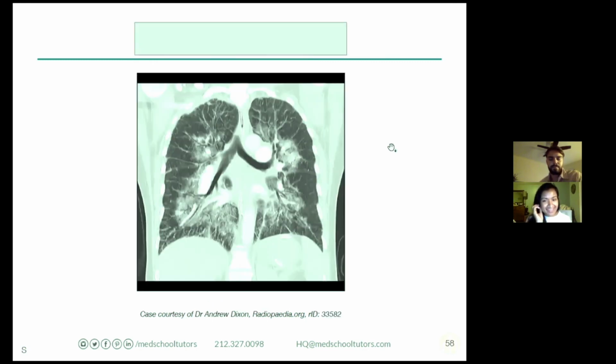Okay. And as a companion case to one of our cases from before, we're now looking at a coronal image. Again, I'm looking at lung windows, and this is a slightly challenging image, but looking at the lung fields, because they're giving us the lung windows for a reason, I see almost the distribution of the branching bronchus. This is the right main stem bronchus, and you see a branch coming up here, here, here. We see this ground glass opacification surrounding the bronchus, and similar here.